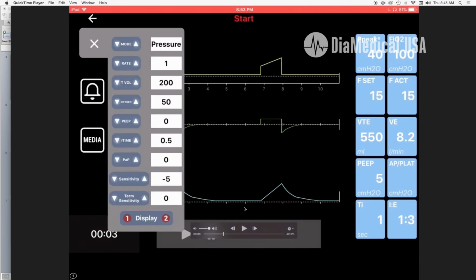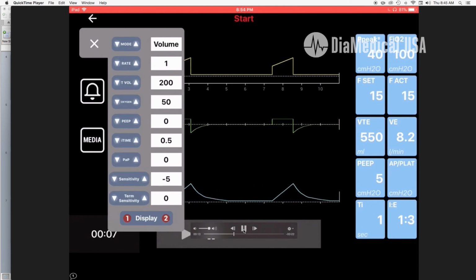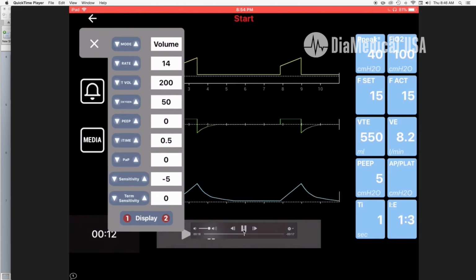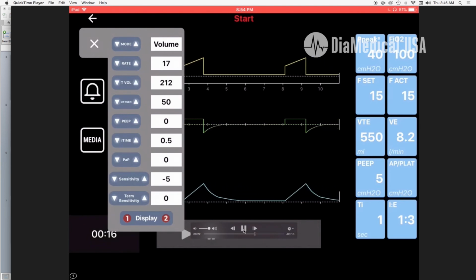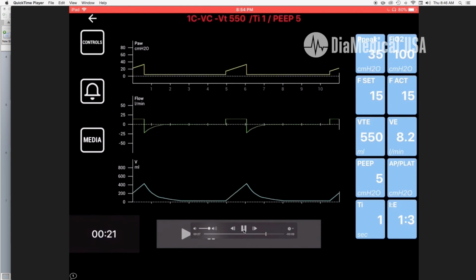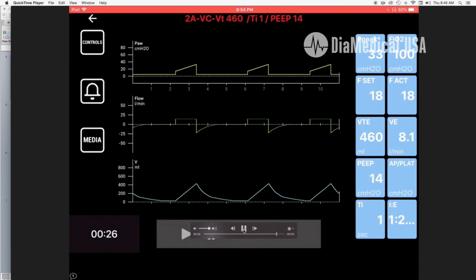Then they'll be presented with the question options that we saw before, and then based on their choices they'll be asked to input any adjustments to the ventilator. They will manually input that themselves and get the practice on doing that. Then they will apply those changes, and the instructor will then decide: did they make the correct choice, the incorrect choice, do we change what's on the screen, does this lead to further discussion? So that is what they are going to see on their end.